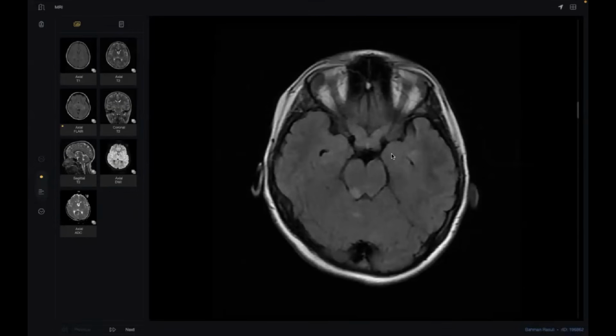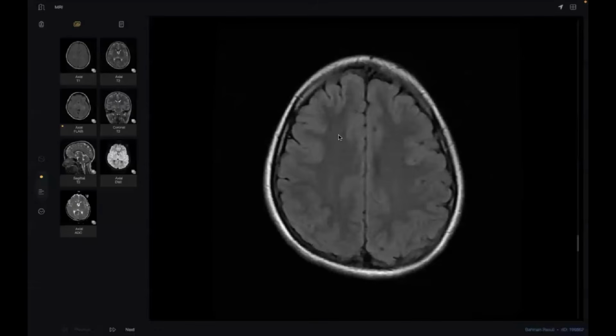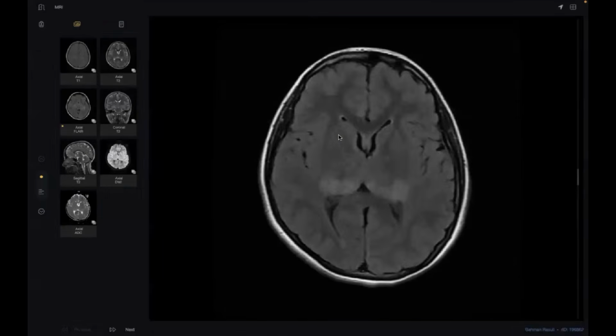Thank you, doctor. It also was a difficult case. Why? Because I gave her a very misleading history. When I told her the patient has acute headache, by the way, it is acceptable. Why? An NF patient, a neurofibromatosis patient, may have acute headache and will come to you for brain MRI or CT. And finally, it was a psychic headache, and finally you find all of this.